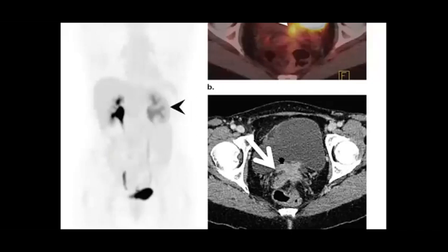Yes, perfect. So you can suspect that there is maybe some hydronephrosis, or you can say that in this PET-CT you can mention that there is persistent nephrogram. Yes, probable, perfect. So there is something going on with the excretion. If I told you that this patient's history includes colorectal cancer, so what happened with this patient?